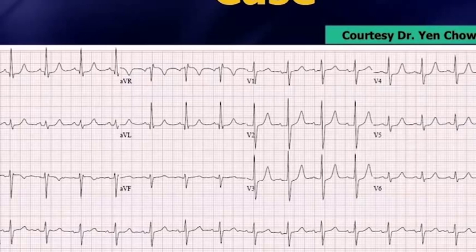If you look out here in lead 2, they'd probably call it non-specific, just a little bit of elevation in lead 3, but it's not elevation in contiguous leads, a little depression in lead 2, maybe a little in aVL and 1, maybe just a tiny bit. But at least a little depression there in V3, V4, V5, and V6.